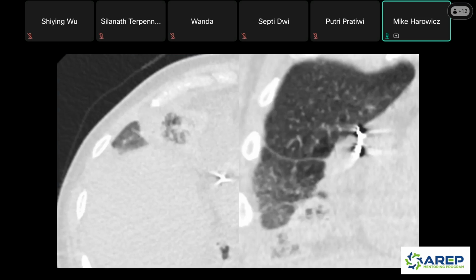Now, these are very zoomed in, so let me give you a little context here. So the left is an axial image. The right is a coronal image. Both of them are very, very zoomed in. Focus your eyes right here where I'm circling on this axial and right here on these coronals. Give everybody a second to take a look at them.